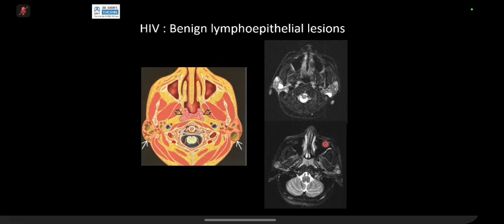Second thing is that in the differential diagnosis, which the candidate mentioned, Sjogren's, etc. In Sjogren's, the architecture of the parotid will be abnormal. In this case, you will see better looking architecture, but the main finding is that you have to look for other bits.